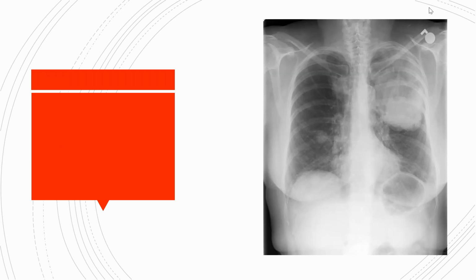Right, so for the sake of time, lots of things here. Okay. So let's see. Yes, malignancy, that's correct. So what do you see here? There's a lot going on, right? A few of you said tumor. Someone said looks weird. Yeah, it does look weird, isn't it? What is it in the top right shoulder? Someone asked. In the top right shoulder, I don't see what you mean. I think it looks fine.